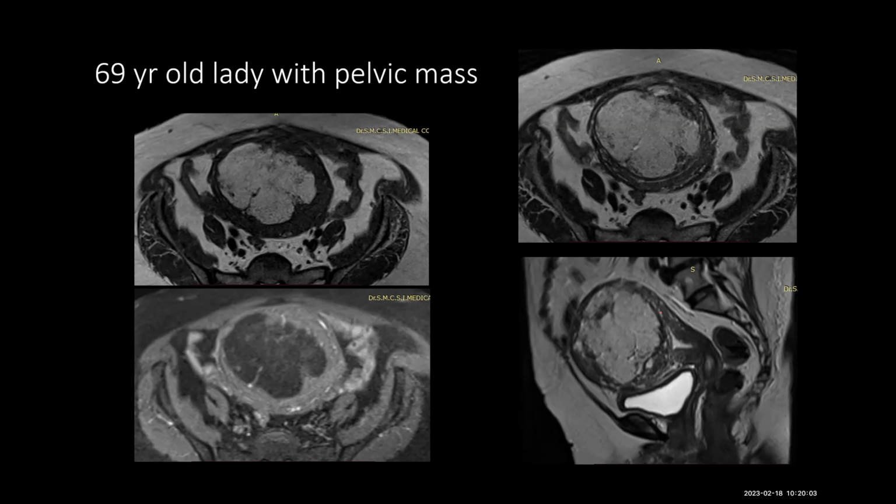The age of the patient is not likely for a dermoid or a teratoma, and the signal intensities are not suggestive of leiomyosarcoma. It is also very unlikely to have this degree of fatty degeneration in a previously known uterine fibroid. So my primary remains liposarcoma of the uterine cavity.